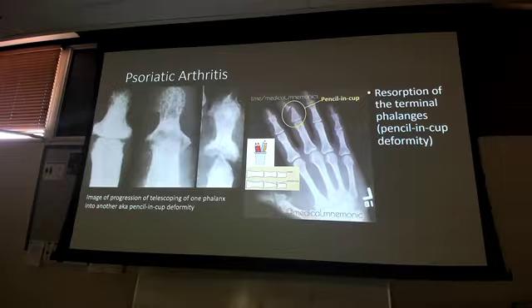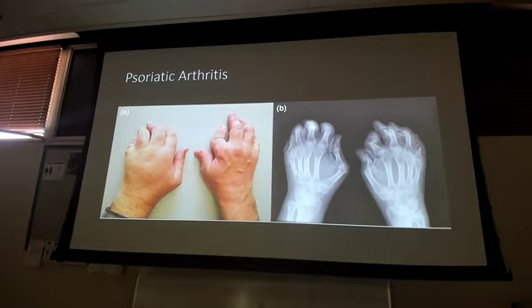Skin manifestation will be helpful. Not always there, but helpful. Here's my sausage fingers. They, no joke, look like little mini sausages. Now, look at their fingers, almost the same kind of aspect of the rheumatoid arthritis that we talked about with the joints and the swelling, right? But what's the difference with these guys?